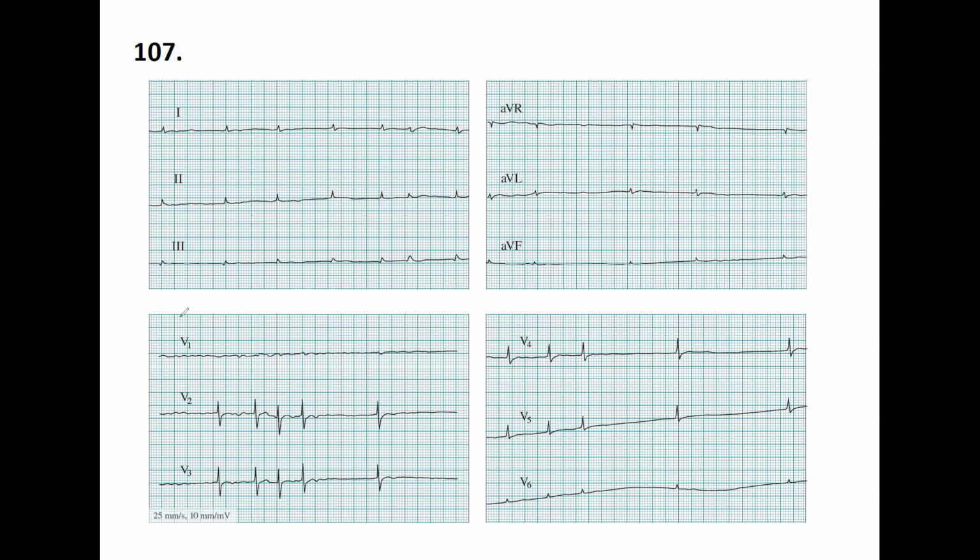We already said this is arrhythmic. Now let's see the rate. Since it is not rhythmic, I calculate the average. There are 5 seconds in this graph, and in 5 seconds there are seven heartbeats, so I calculated the heart rate should be around 84. Great, that's still normal.